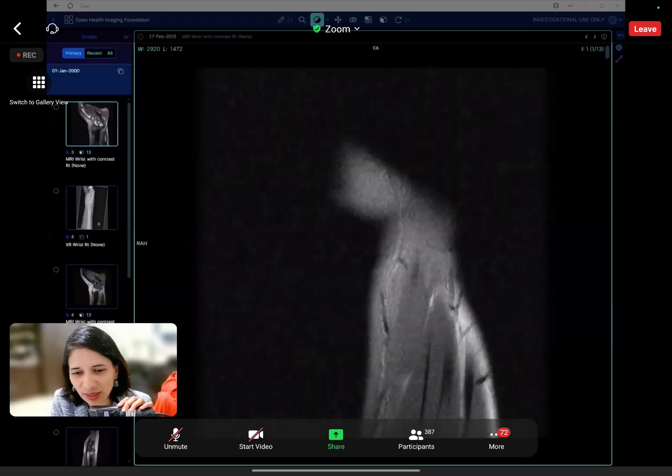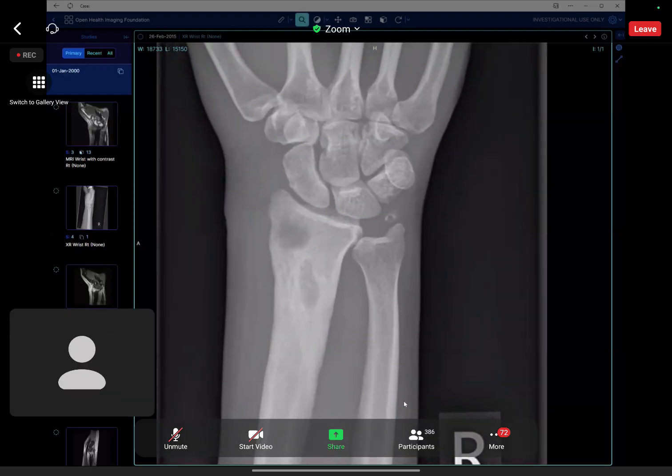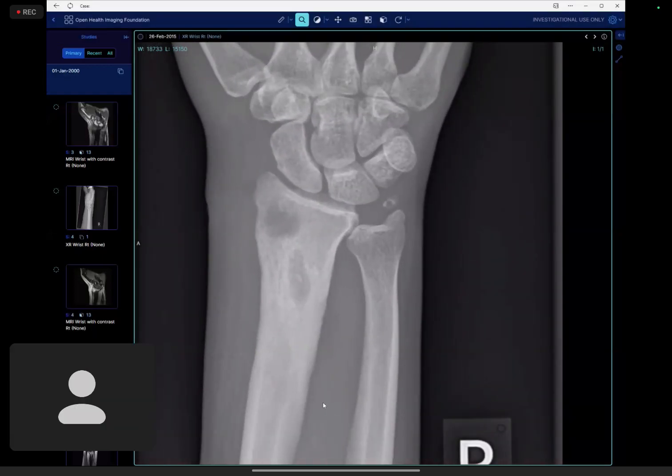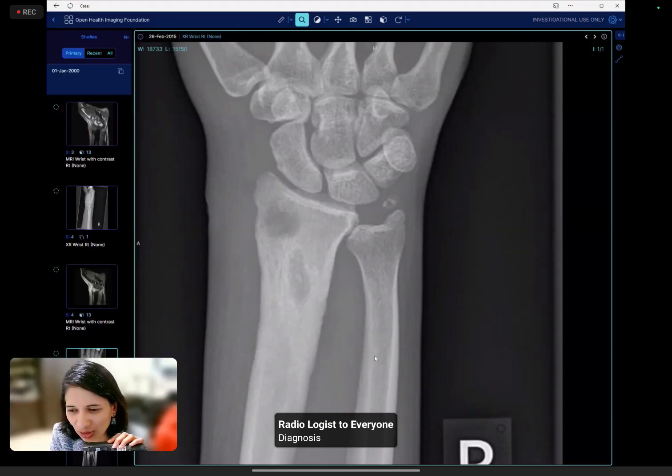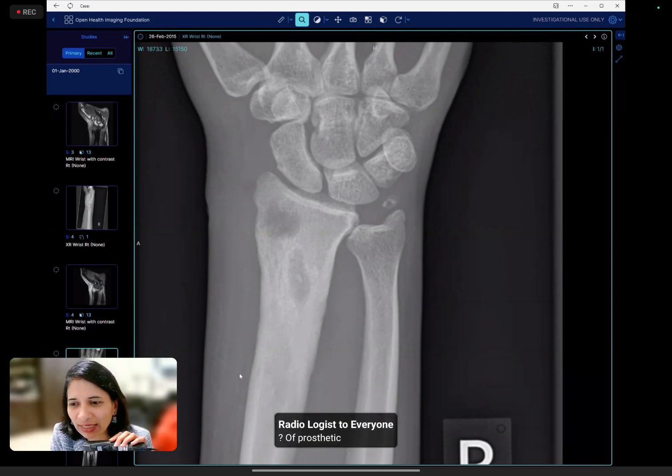So this one, I think you picked it up afterwards, but the other observation, look at the radius itself. Do you think the bone density is normal? Yeah, it's actually increased in bone density with little expansion, sclerosis also. So you lost the corticomedullary differentiation. Can you see? Yeah, it's completely lost, and there's increased sclerosis of the bone there, and you lost the fat planes here.